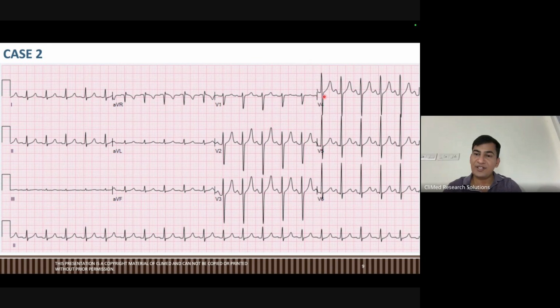See, T wave going upward or higher is not abnormality. The base is base. It is not abnormality. If you're saying that T wave is here, T wave is not touching the line. No, line means where the ST junction origin is touching. ST origin junction is touching this line. ST junction is at the same point with this line.